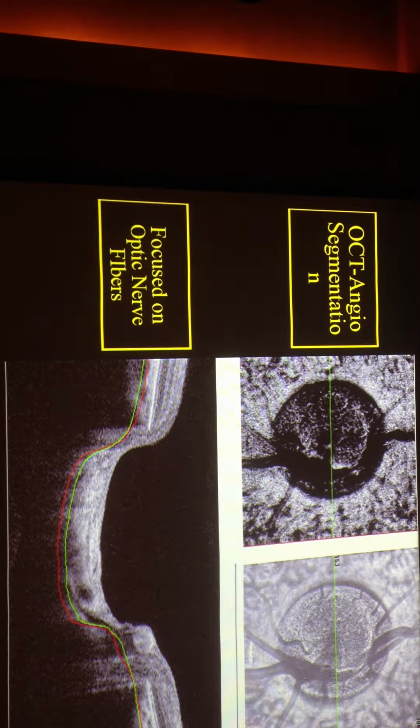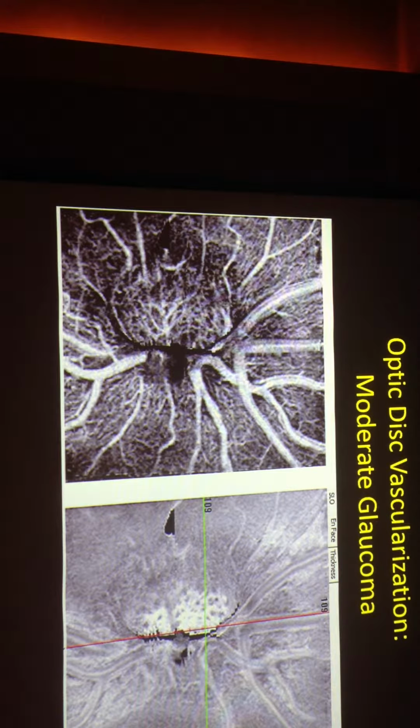And the penetration of OCTA angiography, due to the acquisition system and the treatment of signal, is now a very powerful system to observe this part of the globe. When we have compared patients referred to a center for glaucoma checkup, just regarding the vascularization inside the disc, you can observe this kind of vascularization and a reduction of vascularization in this moderate glaucoma.